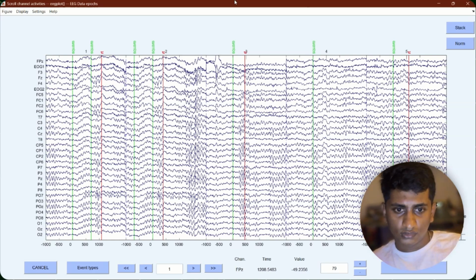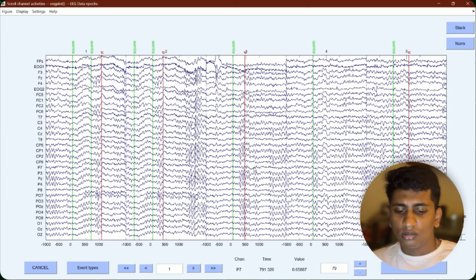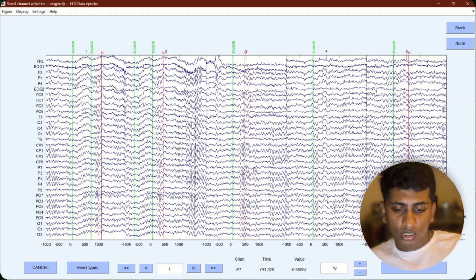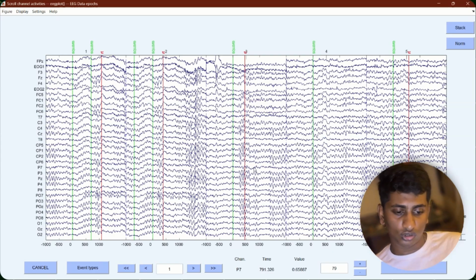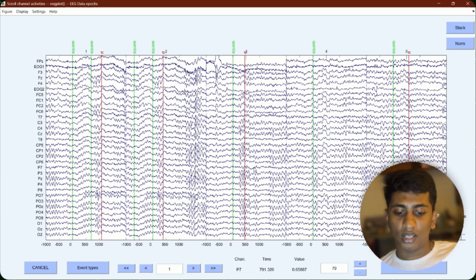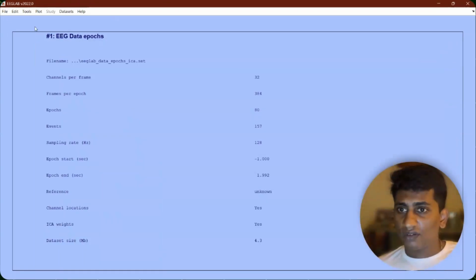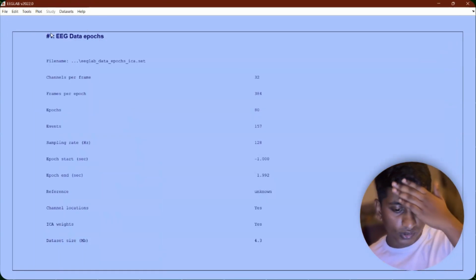So the decision we can take from this is, if there are any large amplitude artifacts, mark the affected trials for epoch rejection later. Like in continuous data, there are non-stationary drifts, so the plan is a high pass at 0.5 to 1 hertz. What is the image processing tie-in? Raw scrolling traces are still a 1D signal, but we can transform these trial windows into an ERP image and spectrograms in 2D for image based classification, which I will be showing next.